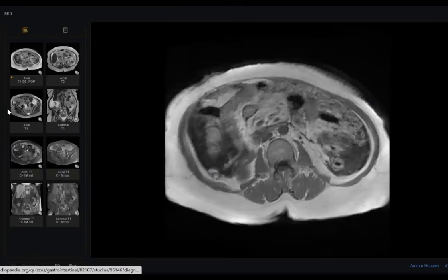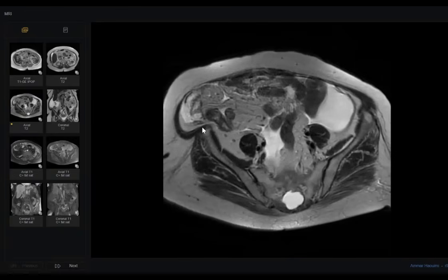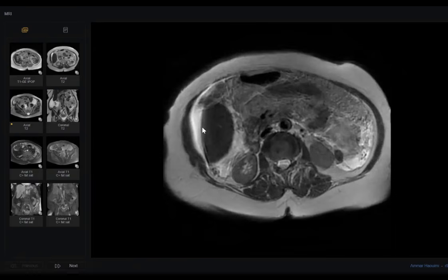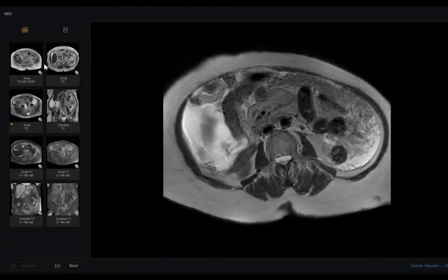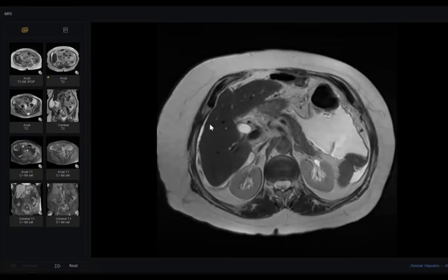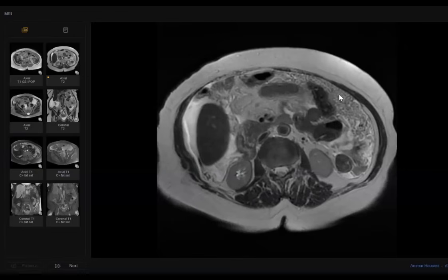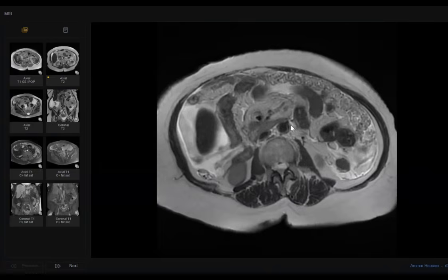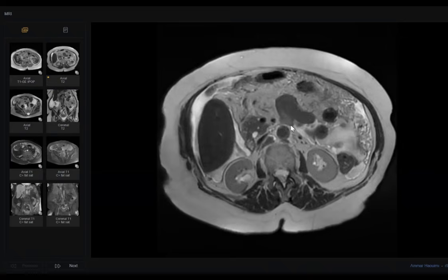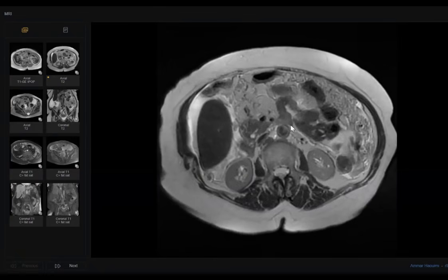What happened here? You are presented with a case of ascites and you are searching for a cause. Number one, liver. The liver looks normal, no portal hypertension. So you are searching for a malignancy. What happens? There is dirty mesenteric or peritoneal caking. So we are searching for something in the abdomen, either tuberculous or malignancy. When you see this caking, keep in mind both of them.